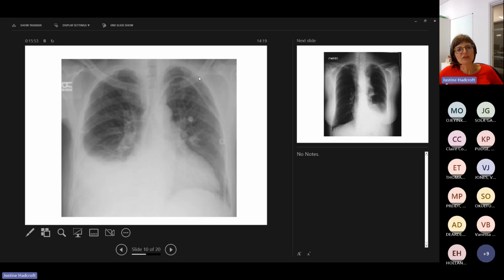So this is perhaps somebody who's very poorly that we've put a subclavian line in to give fluids or to monitor or to give antibiotics, or perhaps we've put this in and then it's misplaced and we're pouring fluid into the right hemithorax. That's always a consideration. If this has come on very, very quickly after we've put this in, then maybe it's misplaced and it's actually dumping its contents into the right hemithorax, which would not be a good thing to happen. I think if it was hemothorax, you'd probably expect it on the same side as the line going in, but it could be. It's definitely a right pleural effusion. It's either somebody who's very poorly and needing monitoring or large IV access, or this might be the culprit.